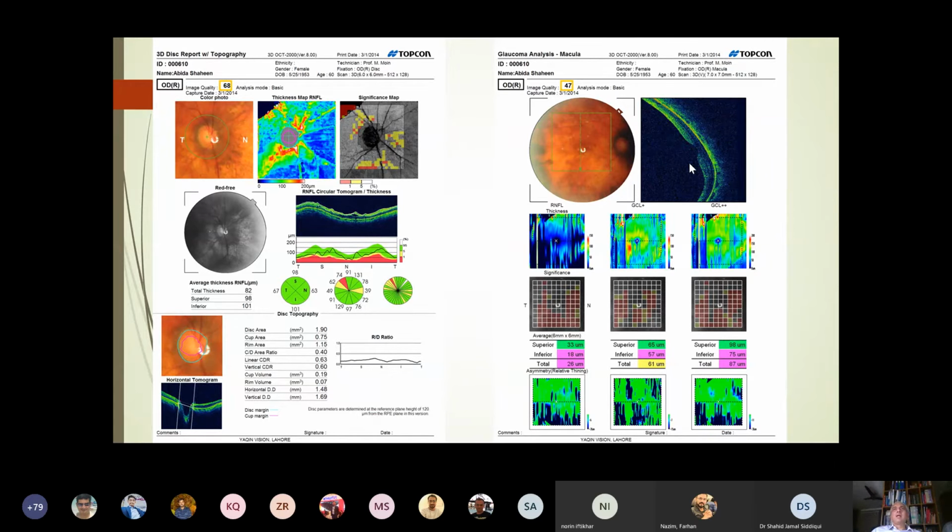Looking at the macular scan, here you can see we do not have our typical donut which you see. So we expect that for this patient we ideally need to have the ETDRS chart over here. And the other thing which you are highlighting is the image quality of the scan is low as well. So that highlights some problem with the scan.